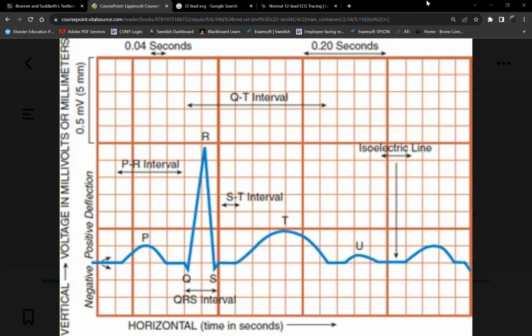And then usually if it's an acute MI, you'll have not only the ST elevation, but since they died, will they repolarize? No. So instead of a positive T wave, this positive means you're repolarizing, right? Since they're dead, they can't repolarize, you have T wave inversion instead.